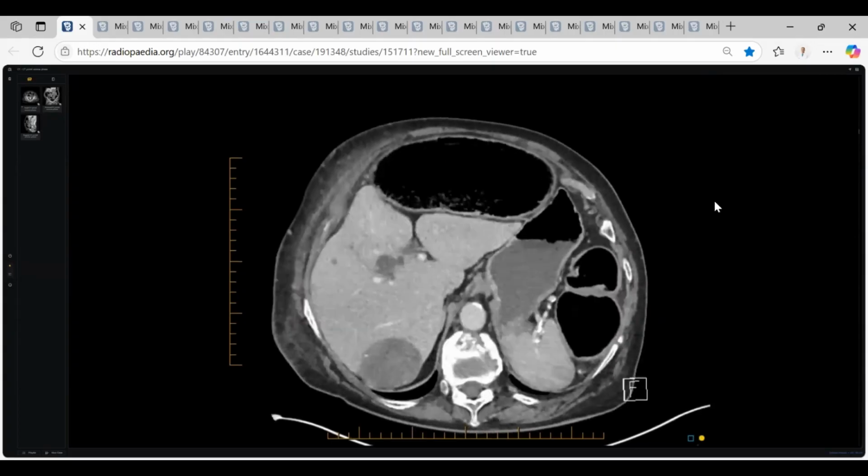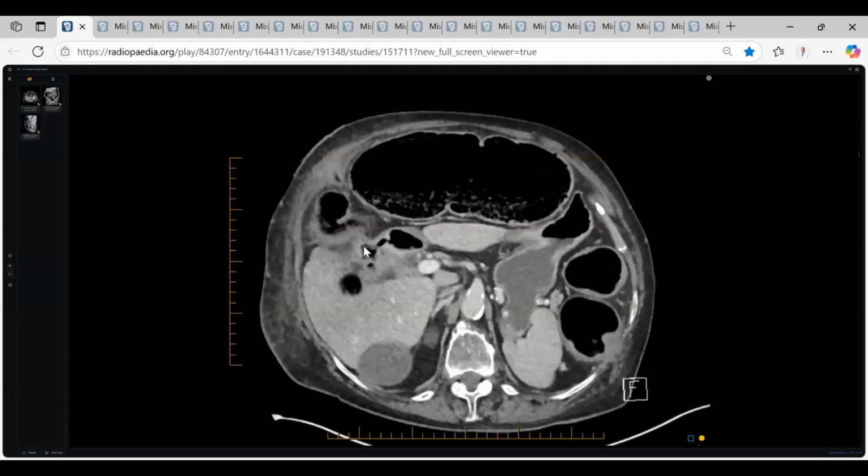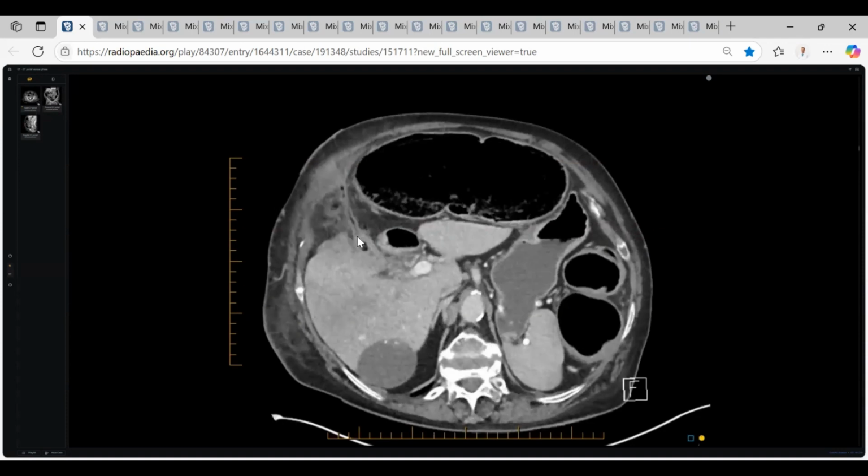Okay, and if I told you, this is the stomach, go down to pick up the duodenum. This is the duodenum, pylorus, then duodenum. Go down. This is the duodenum. Concentrate on it. What happened between the duodenum and the colon here? What is this? Another track. So how many fistulas do we have? Multiple, two fistulas. A duodenal-colonic fistula and a colo-cutaneous, enterocutaneous fistula.